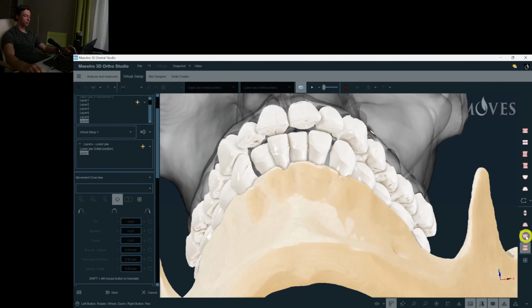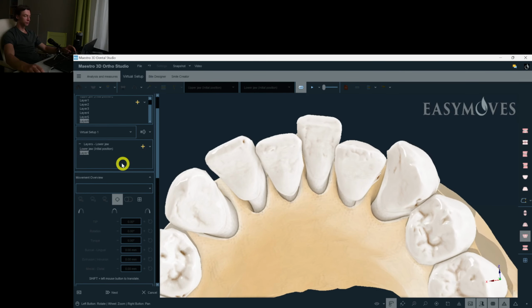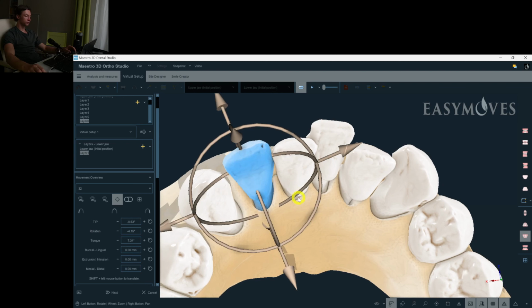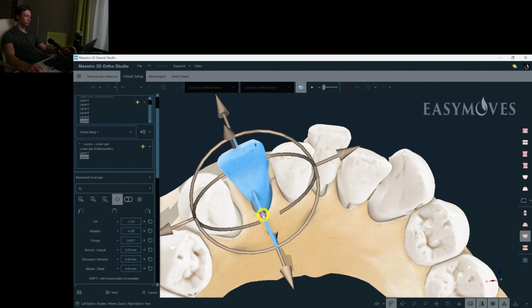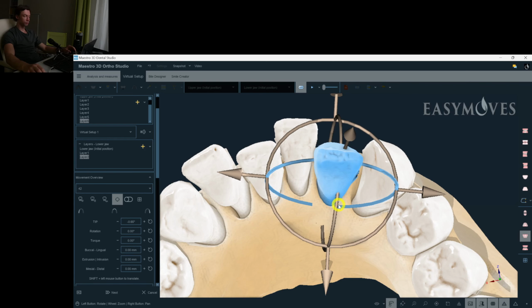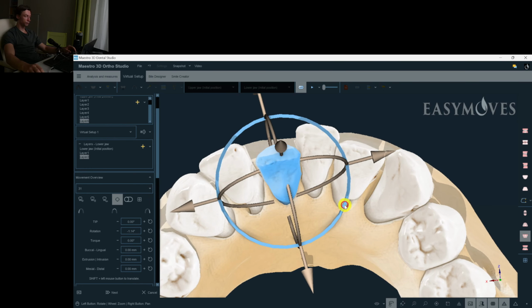Now we'll stop at this point and proceed to the lower teeth. So it was the layer 1, and then I think we should procline the incisors more, gain more space to reduce the amount of IPR.